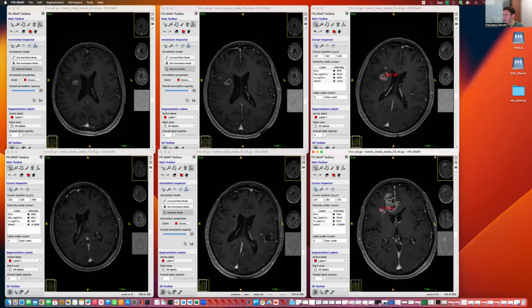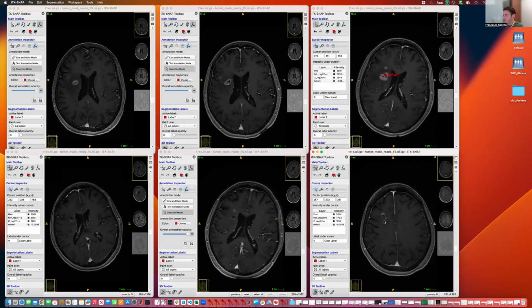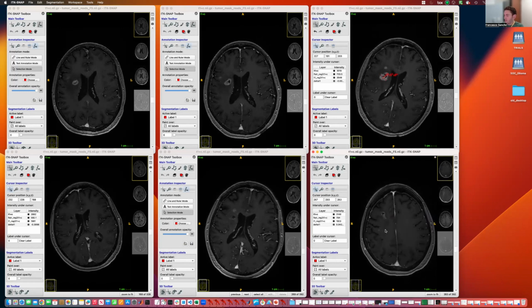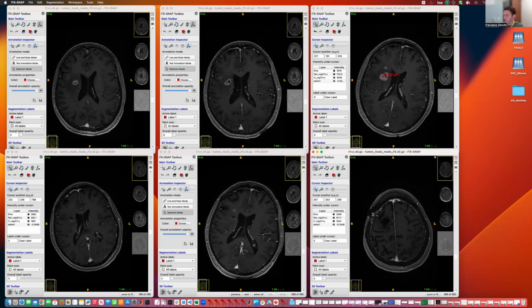Whereas the other nodule that was not measurable before, it's still not measurable, even though it's definitely more conspicuous and more apparent and larger, probably. Additionally, there is this alteration, but I did not consider it as a measurable lesion because I find that most of this enhancement is a rim enhancement, linear, and it represents the border of the previous surgical cavity.